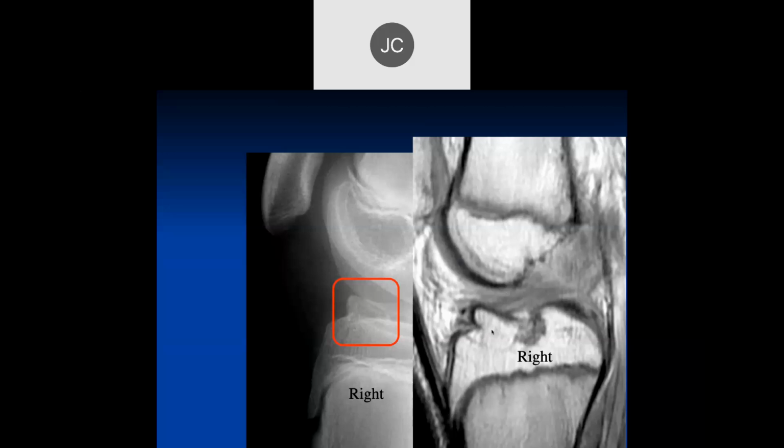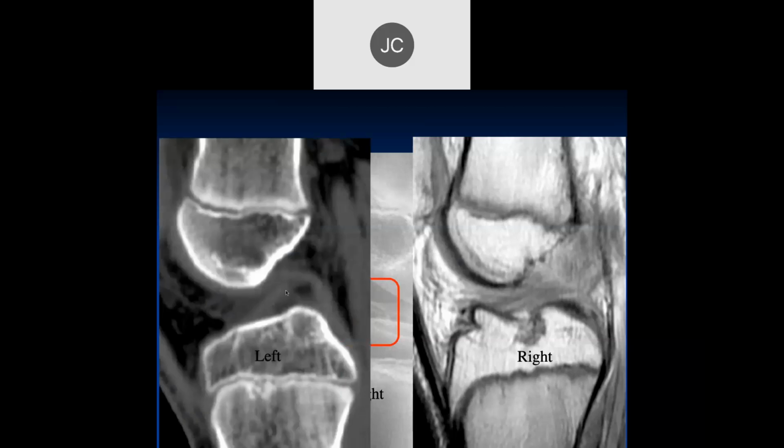and it healed displaced. Now, this patient had trouble fully extending their knee. That's called an extension block. Now, we wanted to get a CT scan, so they brought the patient in and did a CT scan, but they CT'd the left knee, not the right, which was actually very helpful for us because that's what it looked like on the left side, the ACL coming down, and that's what the normal anatomy should be. And this is the symptomatic side. So this is a healed ACL avulsion, but it's healed abnormally in a situation where they get an extension block.